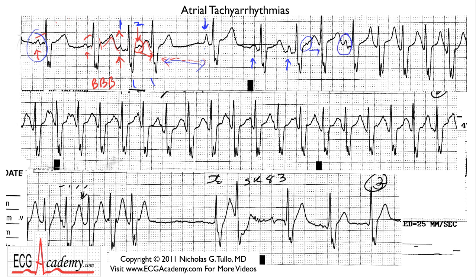And now you see an abnormal P wave that conducts, and then suddenly the heart rate takes off like a shot. Now what we have is a heart rate of about 145 beats per minute, and it's quite steady heading on. In fact, at this point, you have 150 beats per minute, and it's still running until right here when it ends, and you have a compensatory pause. You have no P wave here, so most likely this is a junctional escape.